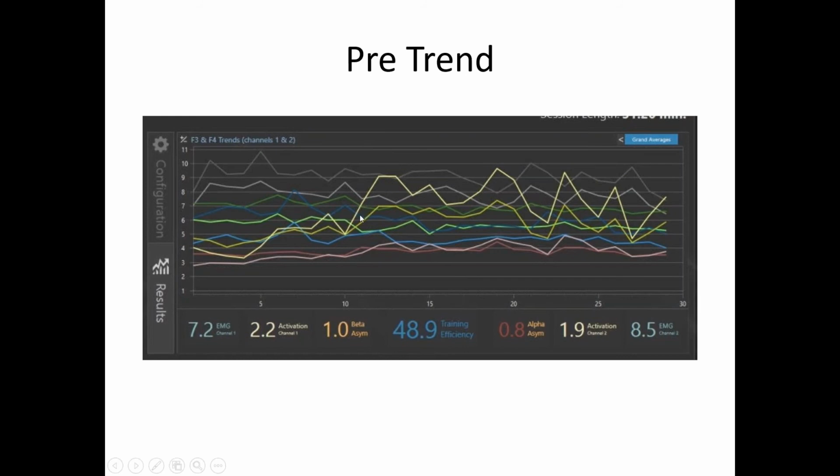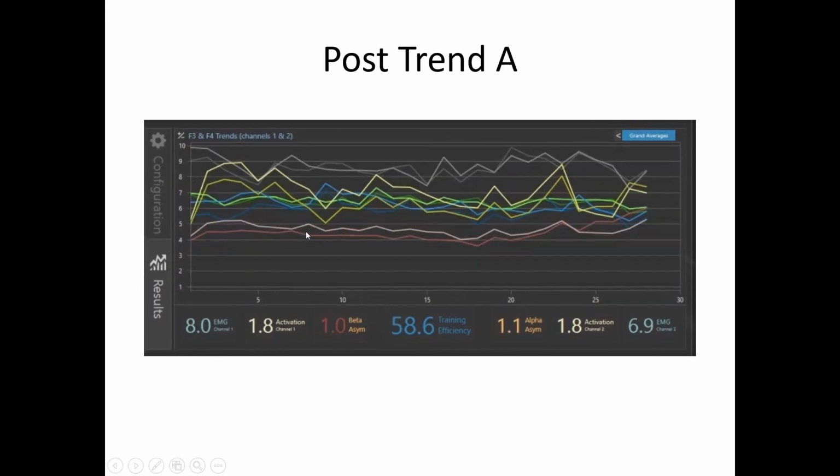So you see this beta, and where does the beta jump up? Right in the middle area of the first session where reorganization's going. And then where does the beta drop back down? Integration and normalization is happening here. You'll see the same pattern over 30 sessions. So let's go to, okay, I trained for 2 or 3 sessions, boom. That looks more organized. Soldier, that bed's got some wrinkles, looks a little better. We're learning how to pick up our messes here.